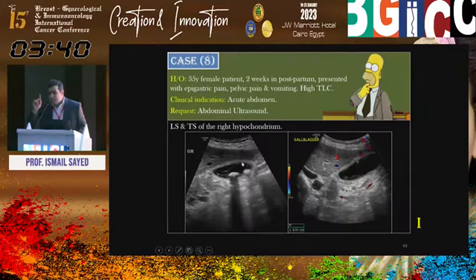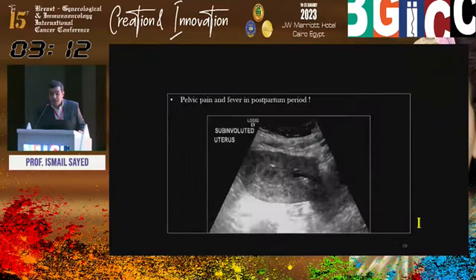Acute calculous cholecystitis is a very good possibility from this appearance, but the gallbladder wall is thickened, not hyperemic. The gallbladder has average extension, not over-distended. Stones are mobile, not impacted in the neck. Still, acute calculous cholecystitis is a possibility, but try to analyze the pelvic pain.